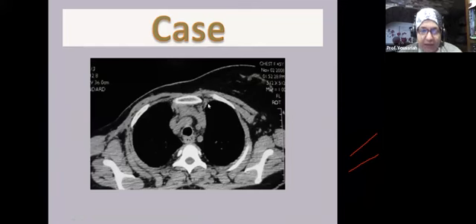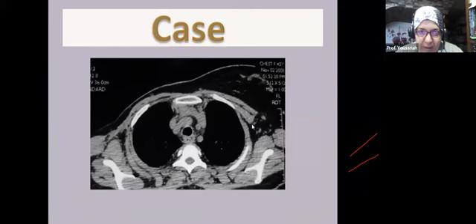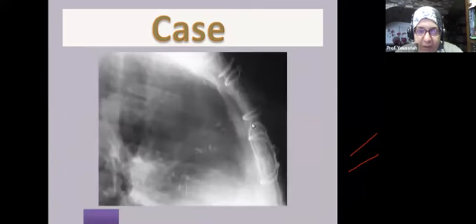Now this case is clear to everybody. I think this is a right mastectomy. Okay. In this case, we have evidence of sternotomy and stippling behind the sternotomy. This is classic for CABG.